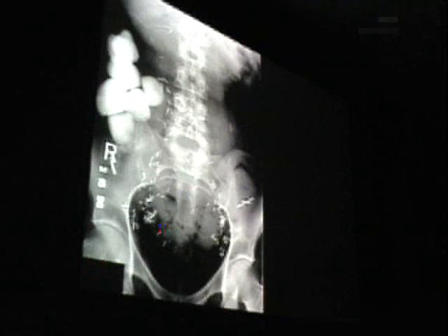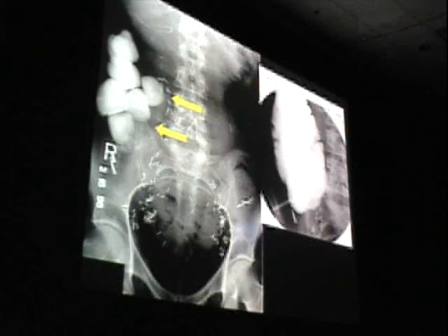And then we have these laminar calcifications, or so-called concretions. And what this tells you is these are marking something that basically is keeping the calcification. And this indicates stasis. Where do we see stasis? In the urinary system, in the biliary system, and then we'll see also enteroliths can give you this kind of calcification as well. Notice it's laminated. We call these concretions. And this basically was in an ileal loop.